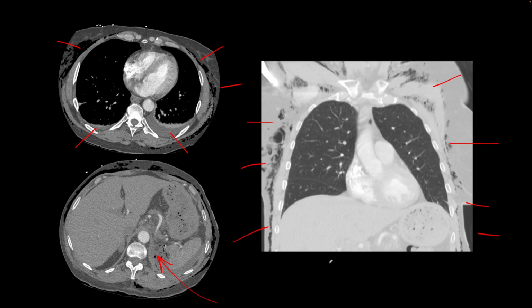And so this was unexpected after their laparoscopic surgery, but this can be seen as a complication of a prior laparoscopic surgery where chest wall or abdominal wall emphysema gets worse after the surgery.